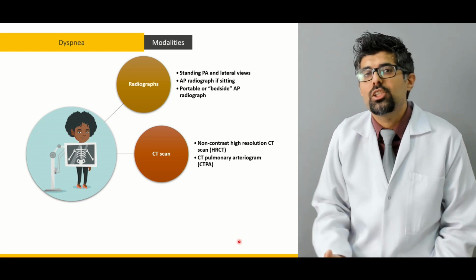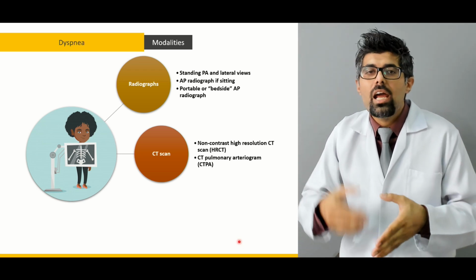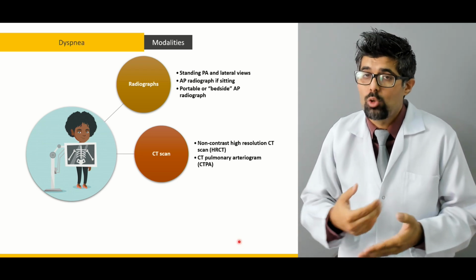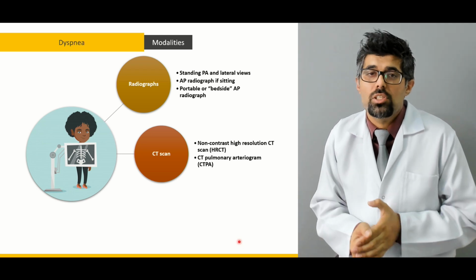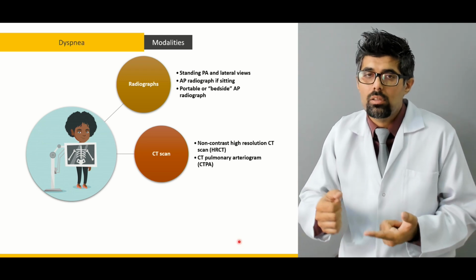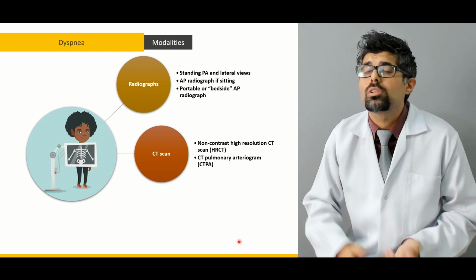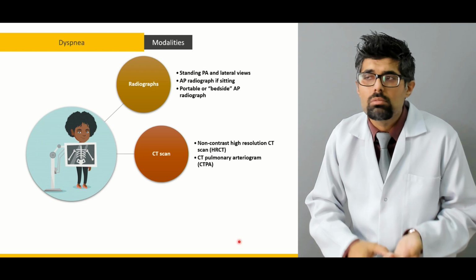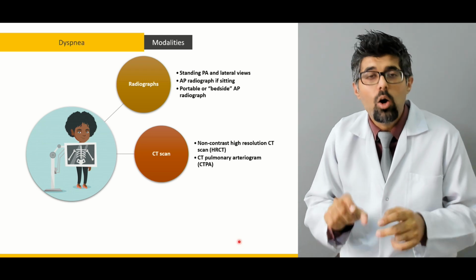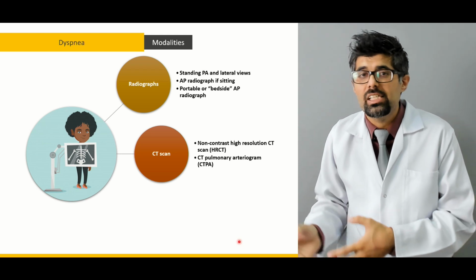Now, this dye moves through the pulmonary vasculature, and whenever it finds a blockage, it stops because the blood is not flowing. Those images can be used to find out any problem, either a pulmonary embolism, some kind of occlusion, stenosis, dissection, ulceration, or some kind of atherosclerotic plaque. All of these problems in the vasculature can be found out by CTPA.